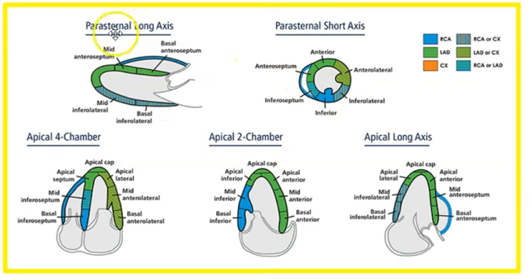For example, in the parasternal long axis view, we have these walls here and these walls here, and these walls are going to be broken down. We're going to talk about that. And you can see here the green is associated with the left anterior descending artery, whereas this infralateral wall down here is primarily served by either the right coronary artery or the circumflex artery, and so on for each view, and we're going to discuss that in more detail here.